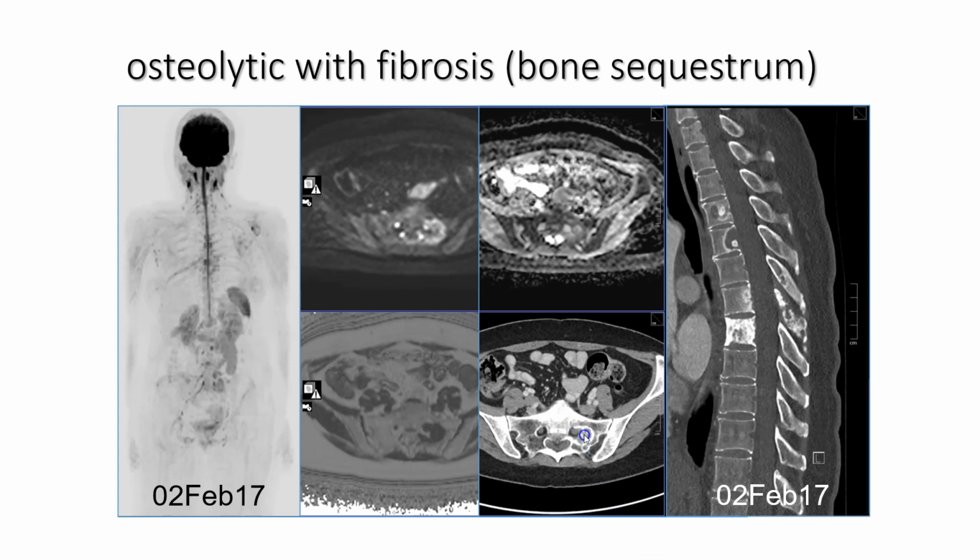Now we would expect the entire lesion to be hypercellular, but that's not what we see. We see that the lesion is cellular just on the margins, but not throughout the lesion, and that's because the center of this lesion is full of mesenchymally derived fibroblasts.